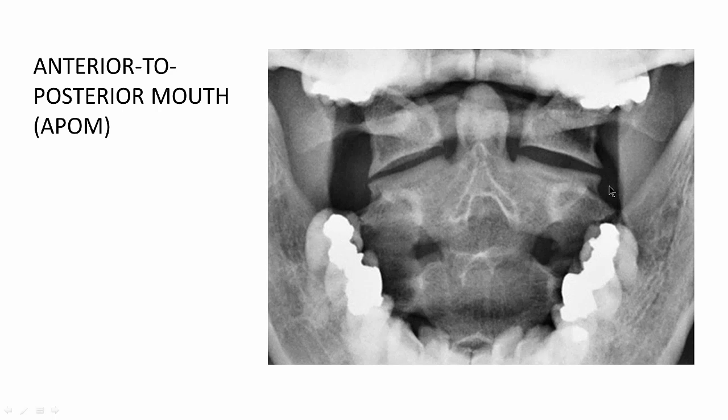So in order to see the top two bones, you need to take a special view called the A to P open mouth. So now we can see beautifully the dens, the odontoid process. And here's that lateral atlantoaxial joint. It's right here. These spaces are very important.